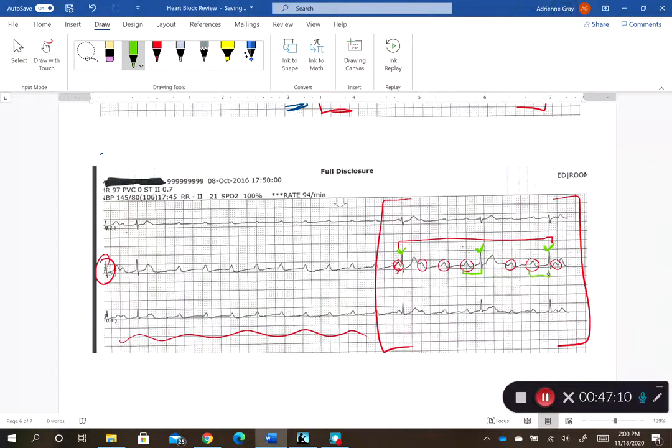So this one is about 10 blocks. This one is about 1, 2, 3, 8, and this one is also 10 blocks. So they are consistent. So I have more P's than QRS's. I don't have a longer drop anymore, but my PR interval is consistent. They're both 10 blocks long. Even though they're long, they are consistent. So now I have a 2nd degree type 2.